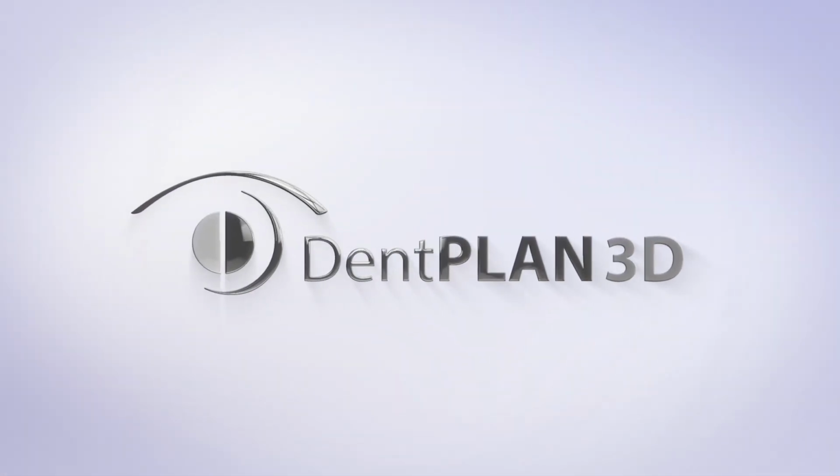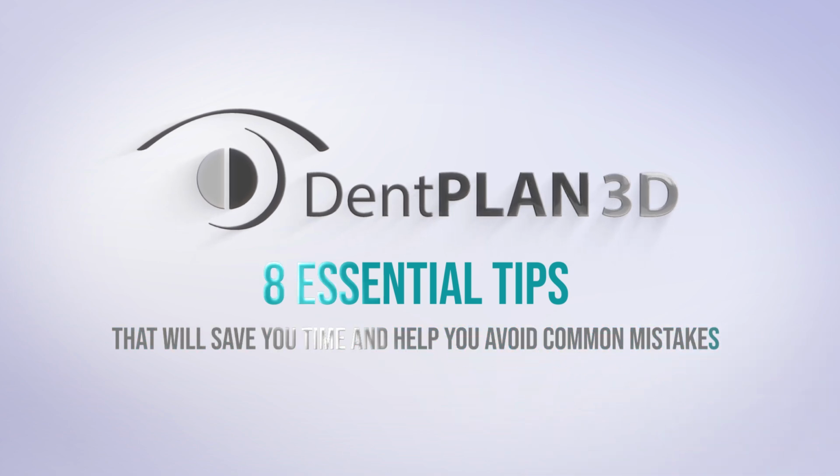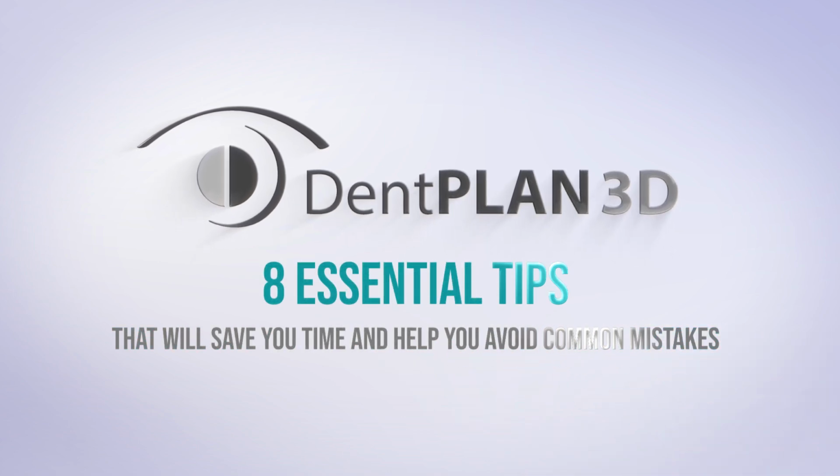We've prepared 8 essential tips that will save you time and help you avoid common mistakes.